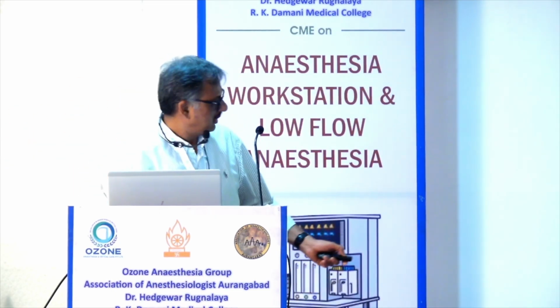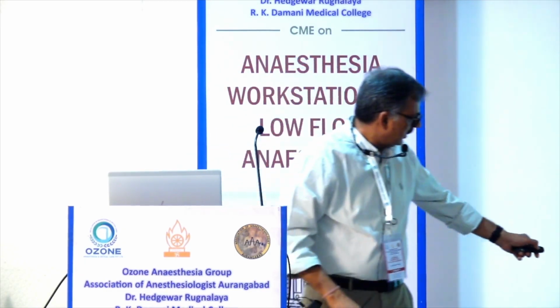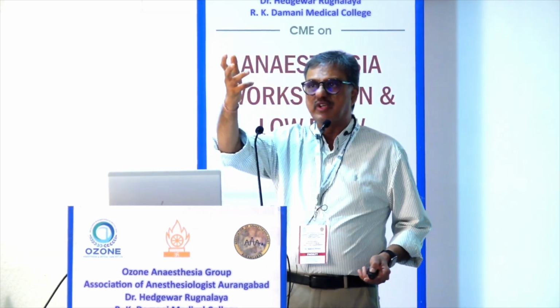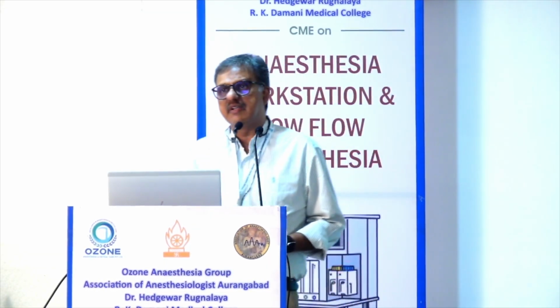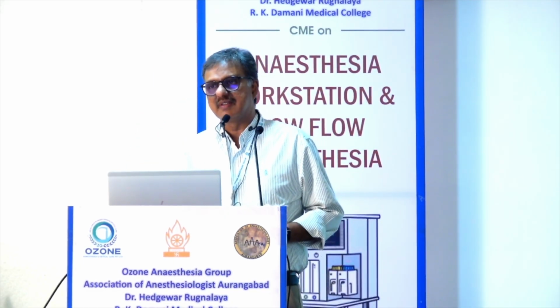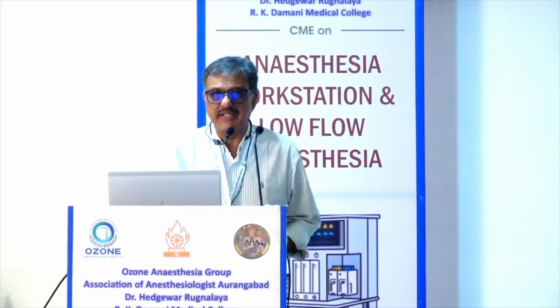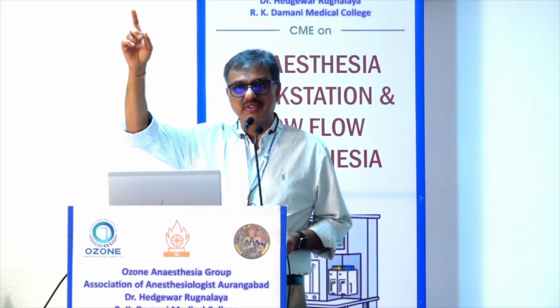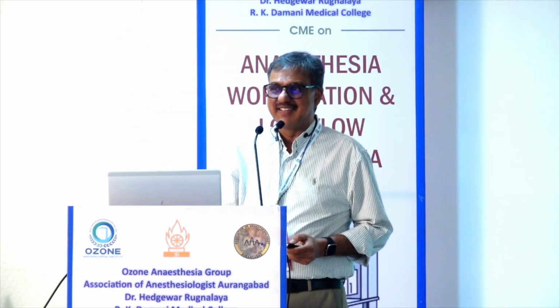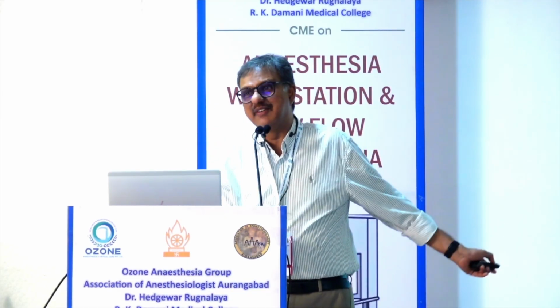But the cost here, 112, is a delivered cost, and 34 uptake remains the same as we discussed. What's the difference in cost? So it's almost 80, and there was 306, 4 times more cost. Just by changing the dial and decreasing the flow, it has made the difference.